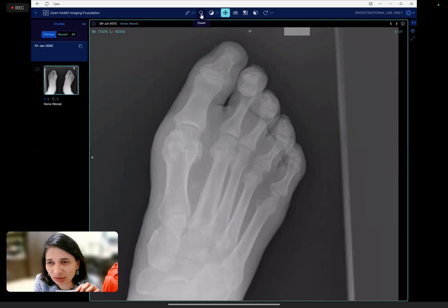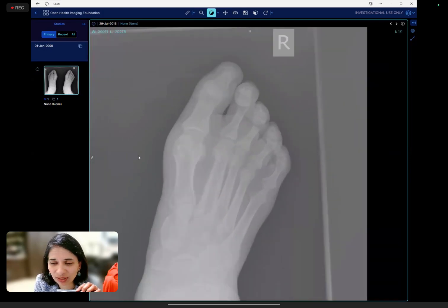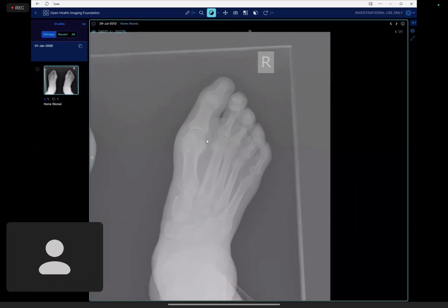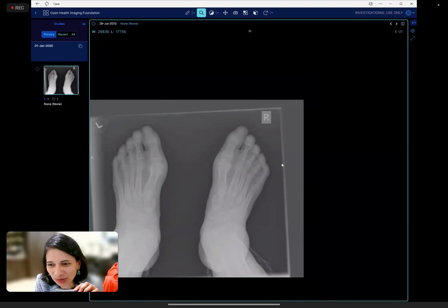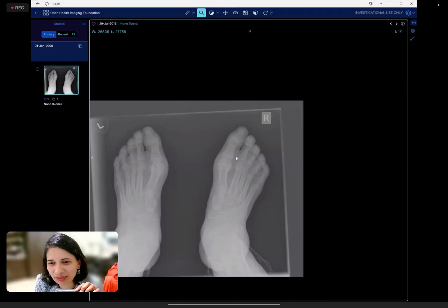I agree with you that in the toe there is one, and you can say, could it be coexisting gout as well. But once you are not on the hot seat, you told all the features of rheumatoid arthritis. So just think bilateral, symmetrical, the distribution is MTP, and many of them are periarticular rather than very away from the joint. Based on all that, yes, it is rheumatoid arthritis.